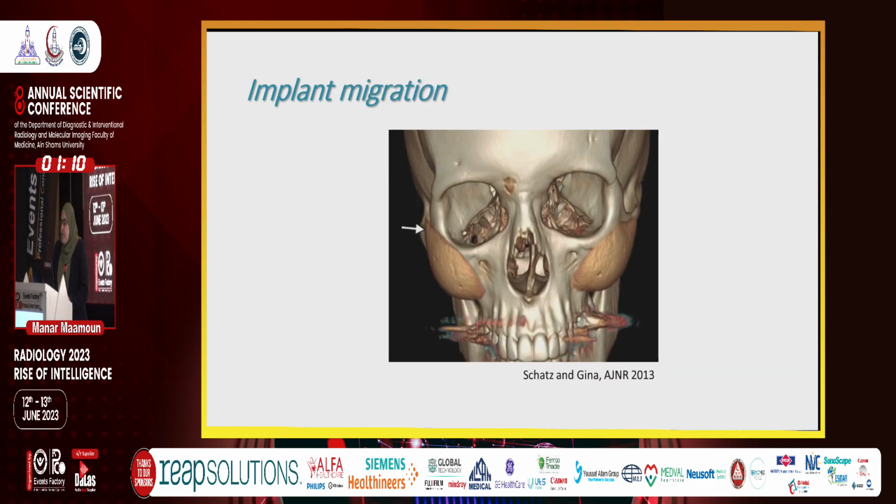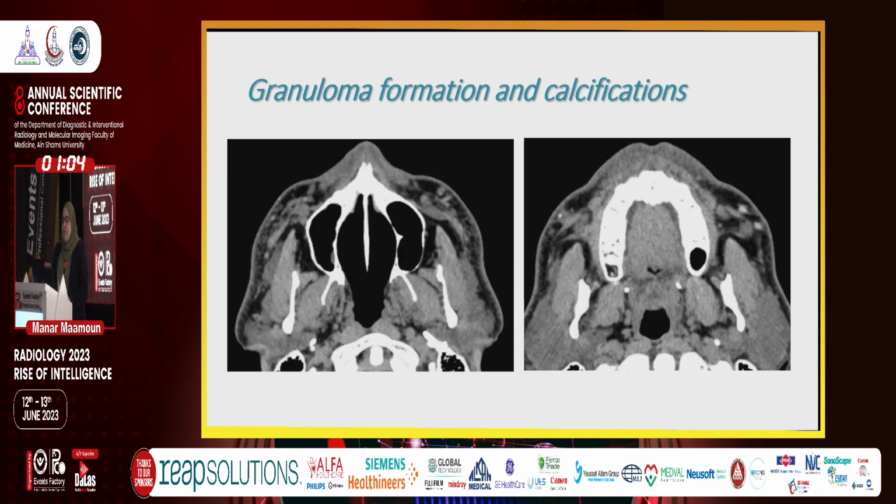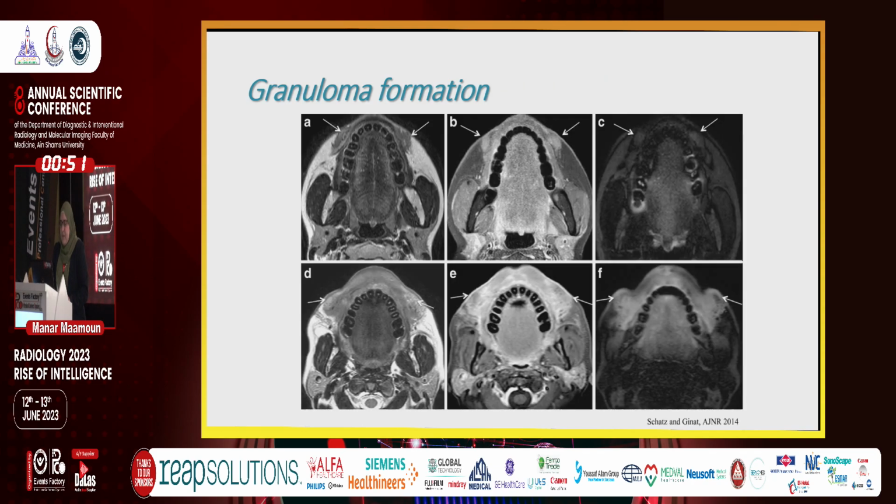Trauma also can predispose to implant extrusion or migration, as noticed here. Granuloma formation and calcification could be noticed after filler injection, especially with long-term fillers. You can notice calcification on CT images. On MRI, you can notice soft tissue masses at the site of the expected filler injection.